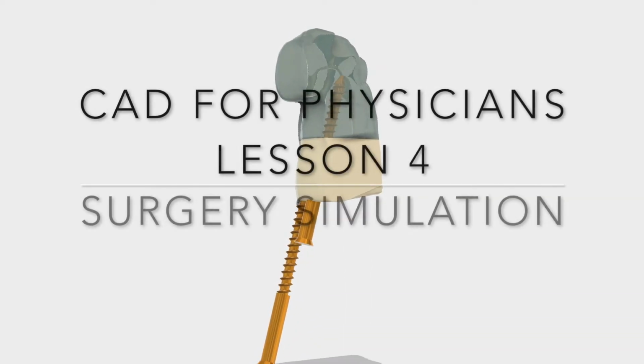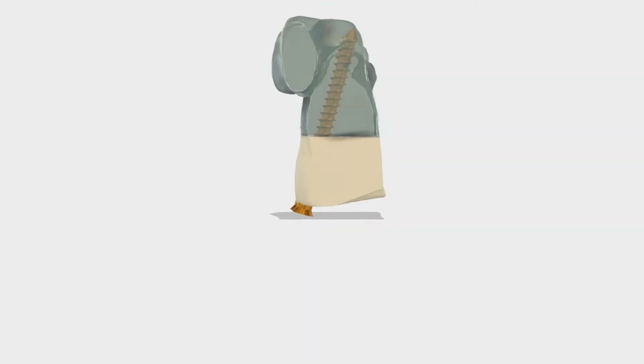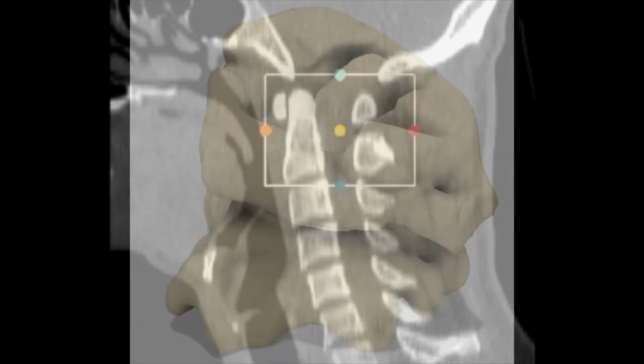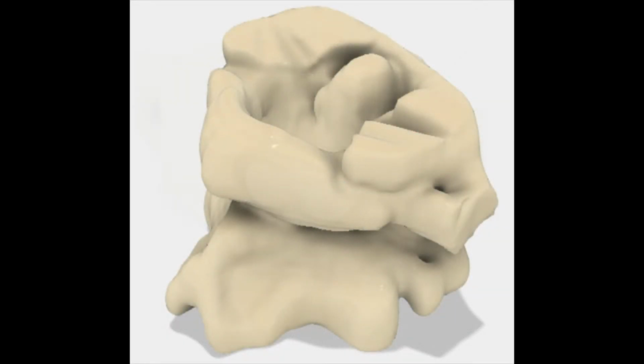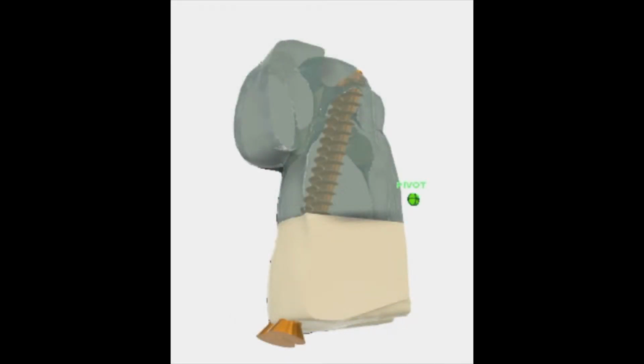In this tutorial, we will learn how to combine organic anatomical forms with engineered objects to simulate an operation. Specifically, we will capture data from a cervical spine CT to create a model of the first two vertebrae. Then we will isolate the C2 vertebra and simulate a fracture. Then we will determine what the optimal specs would be for screws that would transfix this fracture.